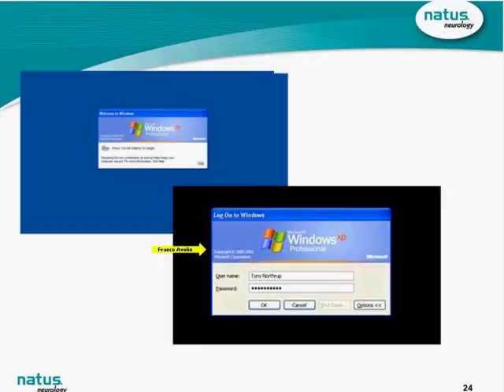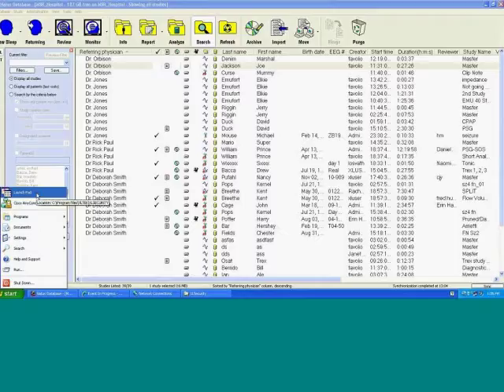So, for example, we talked about the ability to lock a user out from their password after failed attempts. You're unable to do that unless you're using Windows infrastructure to create some additional policies. So the XLSecurity Screensaver, the Launchpad, the desktop restrictions, you lose all of that when you resort to the Windows login option.